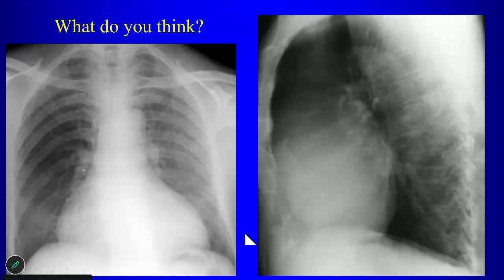All right. This particular chest radiograph, what's bothering us here? Heart's big. Why is the heart big? How do you know it's a pericardial effusion? What do we call the sign? Sandwich sign or Oreo sign, right? So this lucency is what? That is epicardial fat, right? This lucency out here is mediastinal fat. What's in between? That's the pericardial effusion.